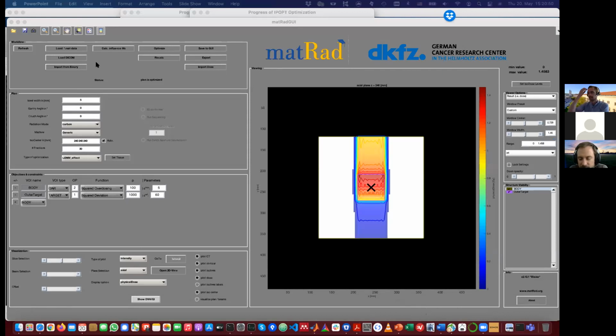Yeah, exactly. More important is that you understand the concepts that we want to transport. The computations might be really heavy here. For example, for this reason, we cannot show you robust optimization because that puts even stronger workstations sometimes to their limits. So if some of you find it runs very slow, we are sorry for that.